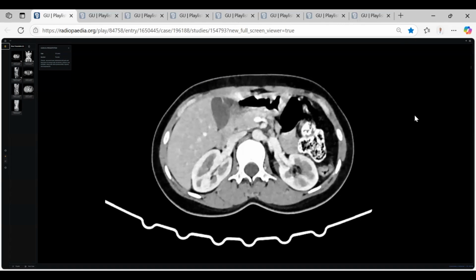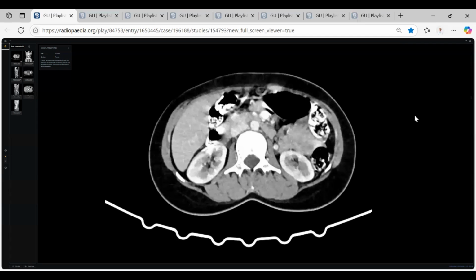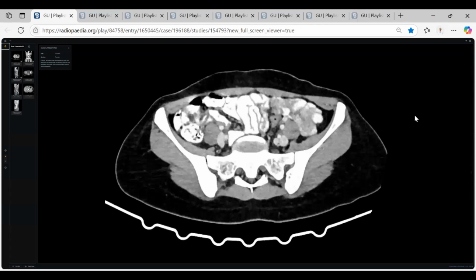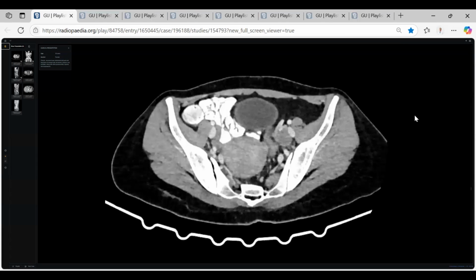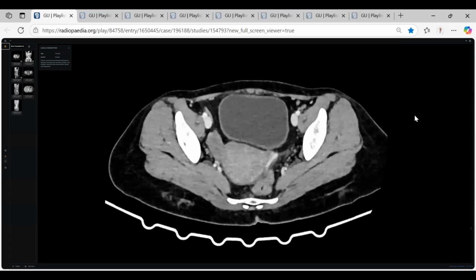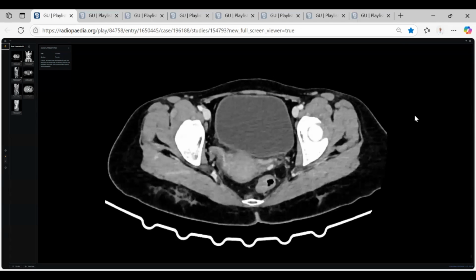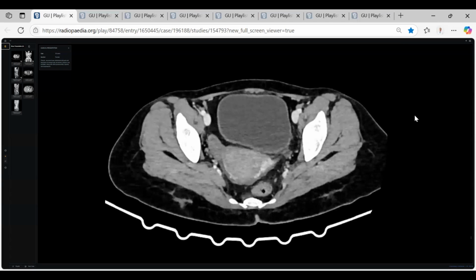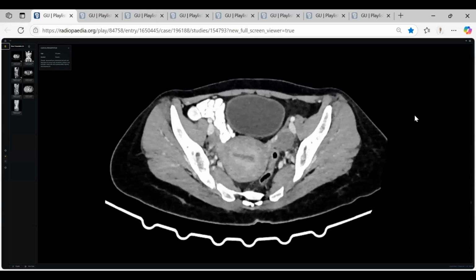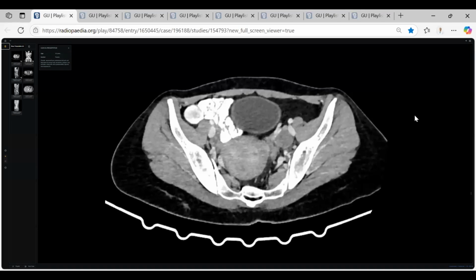The kidneys are in the corticomedullary phase. I will take a moment to go through all the images. In this current study, I've found that in this female patient the uterus is a bit bulky. There are prominent parametrial uterine veins. There is endometrial fluid.